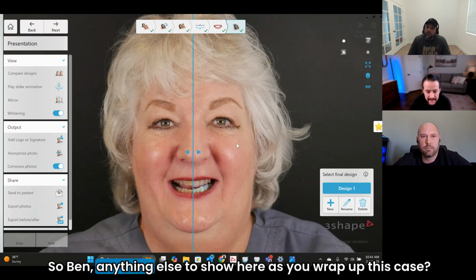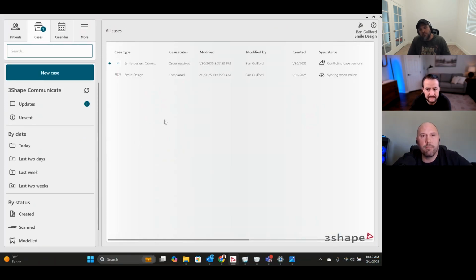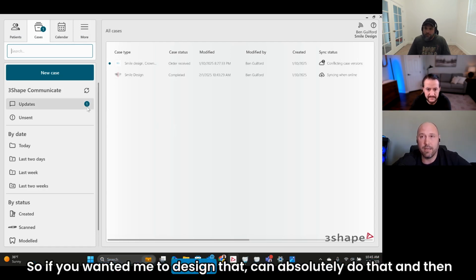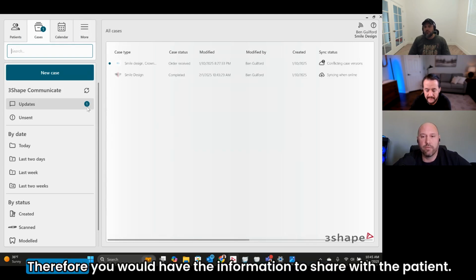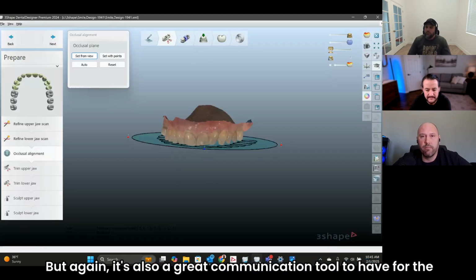So Ben, anything else to show here? Absolutely. As you wrap up this case? Nope. From here, what would happen is the doctor would print those off. I can send this back to the doctor for his analysis. So if you wanted me to design it, I can absolutely do that and then just send it right back to you. Therefore, you would have the information to share with the patient. But again, it's also a great communication tool to have for the final.